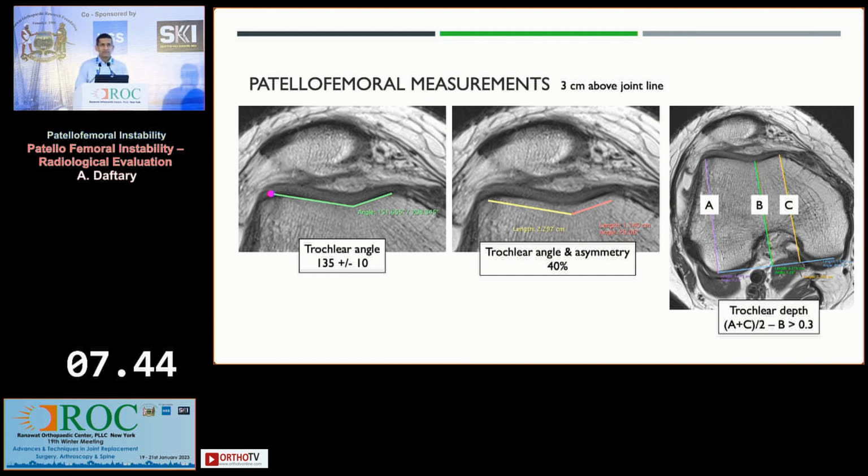There's obviously a large number of patellofemoral measurements that one can use, everything from a trochlear angle, asymmetry, trochlear depth, and a whole host of these, which can be measured on MR using some fairly standardized techniques. I think the only thing, again, when I get phone calls from orthopedic surgeons specifically requesting one measurement and hopping on it, we used to have an old saying in radiology, which was, there's nothing more dangerous than a radiologist with a ruler. I think there is one thing more dangerous, which is an orthopedic surgeon with a ruler, because they actually do something. We're just sort of throwing around words.